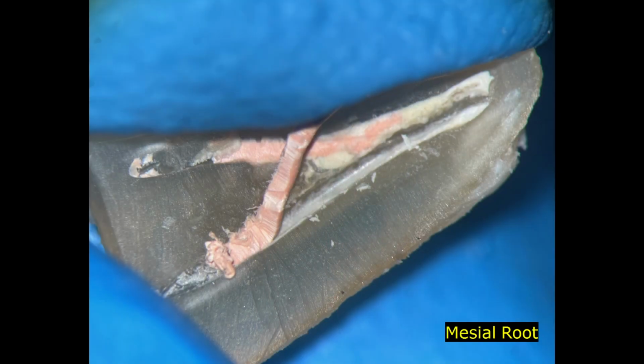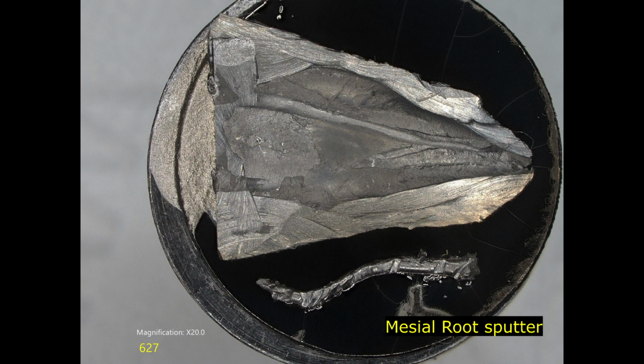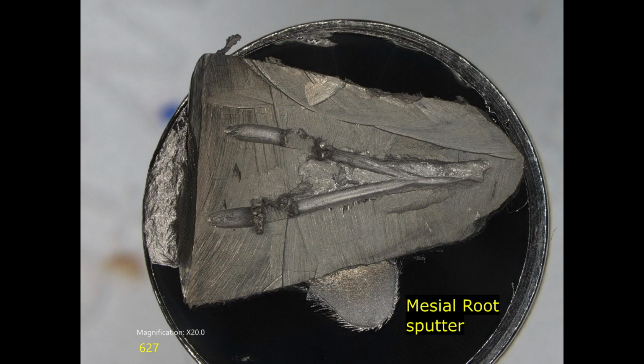After dehydration and ascending alcohol rinses, as per our protocol, the remaining gutta percha was teased out of both mesial and distal canals, and the sections sputter-coated with 20 nanometers of gold palladium. This is the mesial canal sputter-coated sample with the removed GP. This is the alternate side where you can see clearly the instrumentation paths.